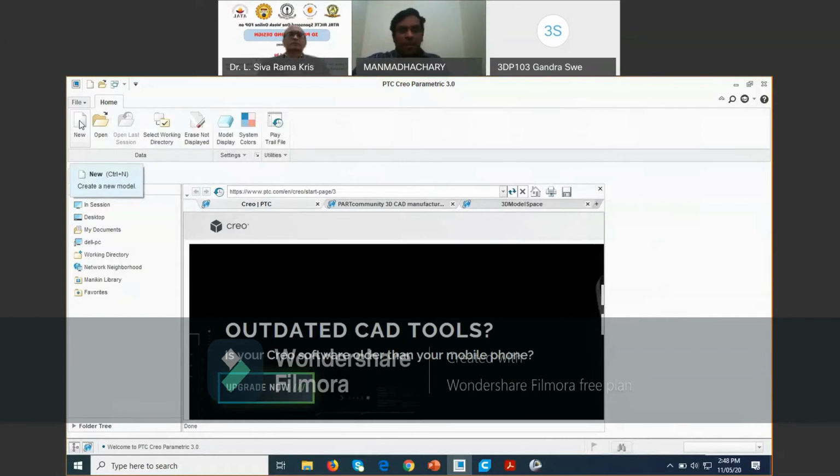Now I'm giving a small demo here: how to convert the CAD model to an STL file in the CAD modeling techniques.